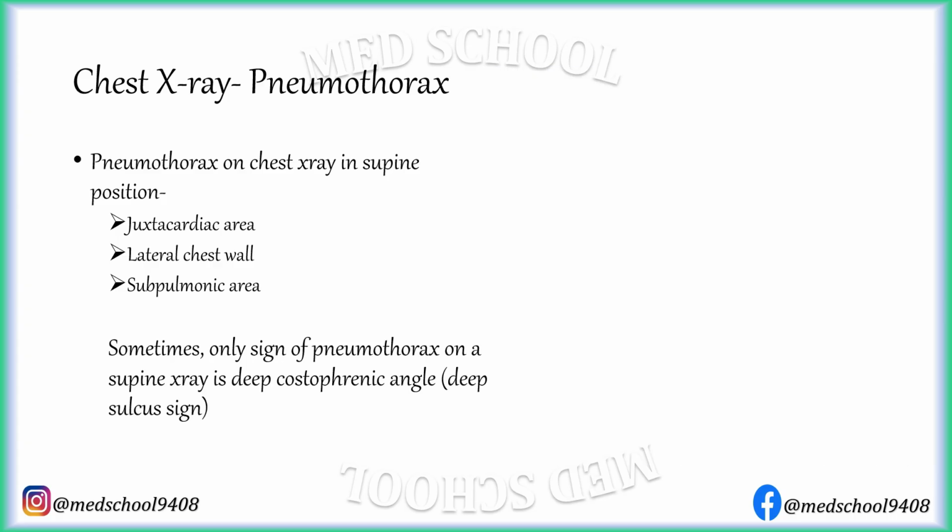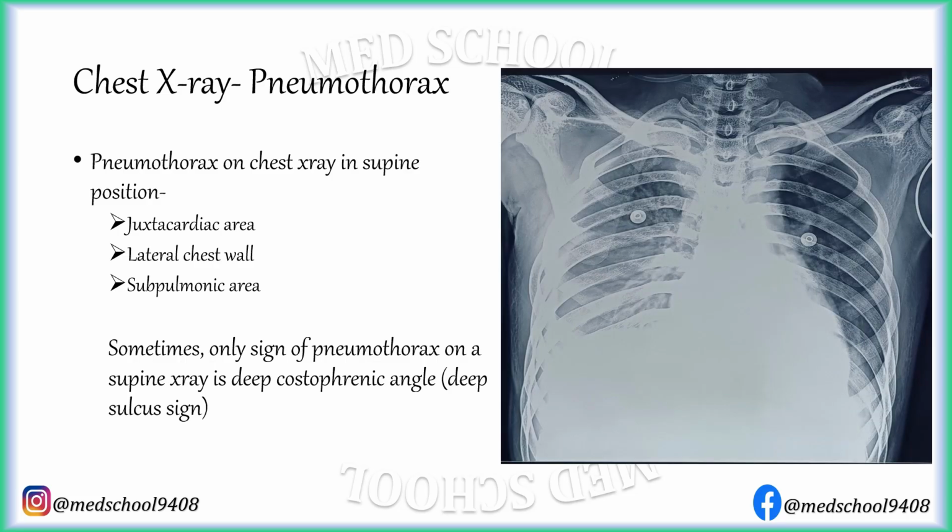Sometimes, the only sign of pneumothorax on a supine X-ray is a deep costophrenic angle, which is also called the deep sulcus sign. Like in this X-ray, the left CP angle is so deep that it is not even completely visible in this film.